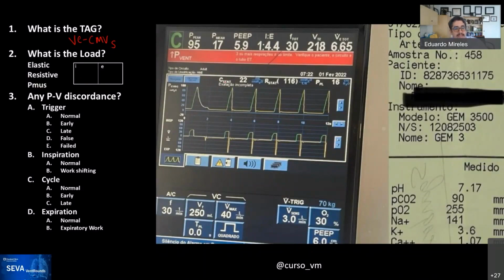So let me give you one hint, and this may help you a little bit. You see what's happening here. There's a breath, right? In first breath. Yes. And then after the breath, there's no exhalation, right? You see here, this is exhalation. There's no exhalation. Right. And then actually they release the inspiratory pause. There's exhalation, and then it continues to go. So what happened here? Oh, did they do an inspiratory hold? Yes, this is an inspiratory hold.